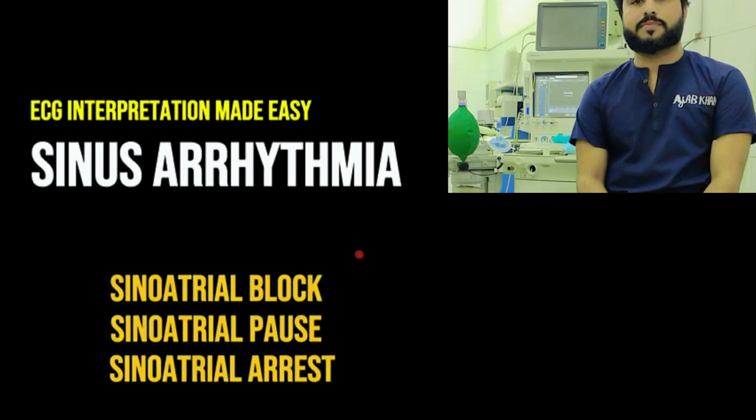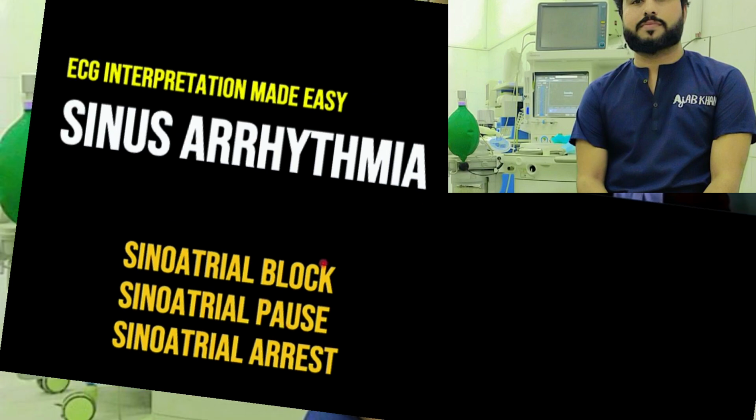Okay, in our video series of ECG interpretation made easy, in this video we are going to talk about sinus arrhythmia. We are also going to discuss sinoatrial block, sinoatrial pause, sinoatrial arrest, and we will solve many important ECGs.